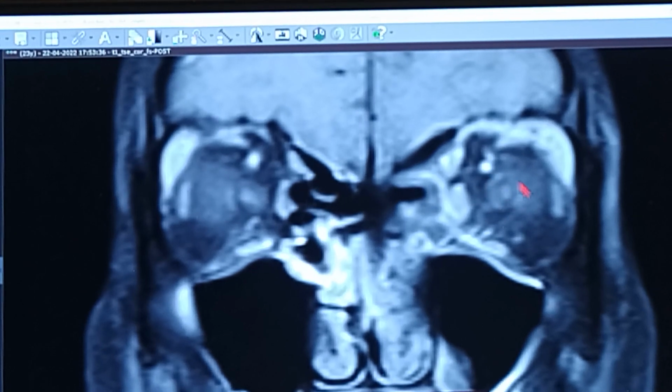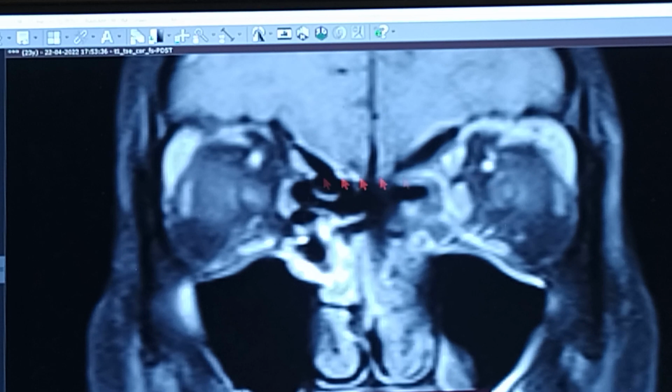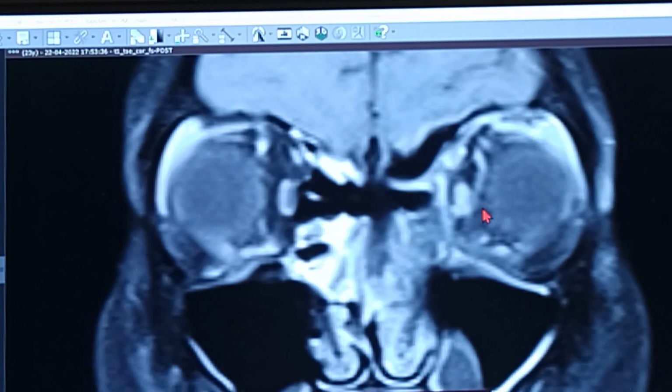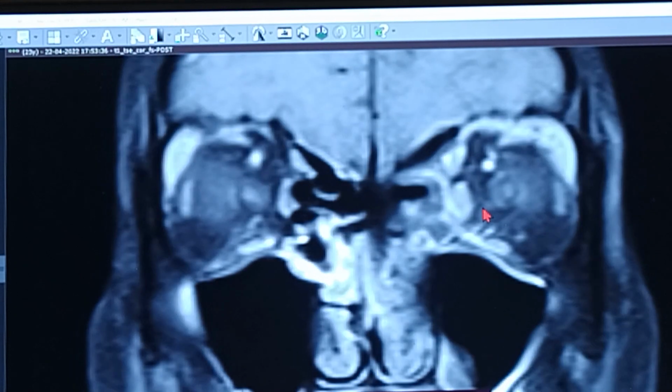And you can see this is the optic nerve. In the anterior part, it travels superiorly and medially. So this is the anterior part because this is the anterior ethmoids, and this is the ophthalmic artery. You can see right there, post contrast T1 ophthalmic artery. So that is the ophthalmic artery, and sometimes you can actually see the ophthalmic artery giving a branch.